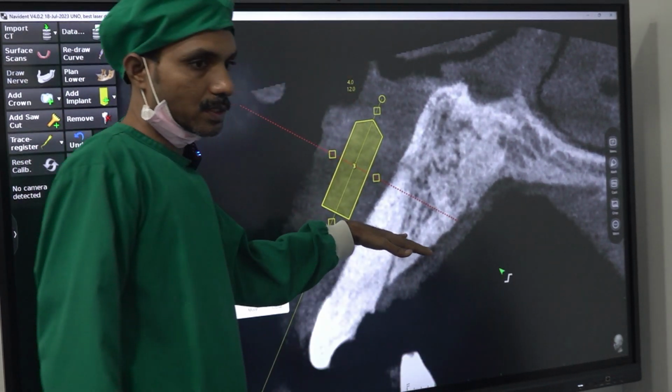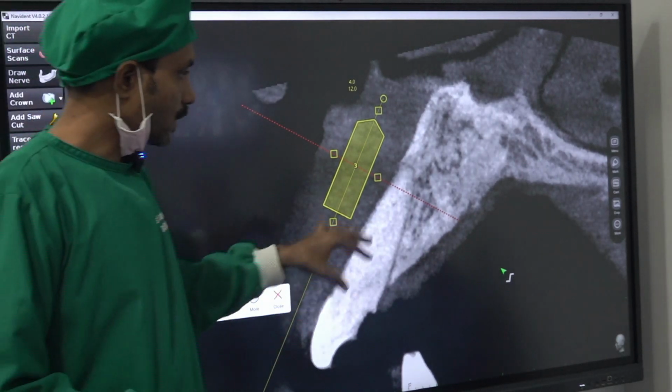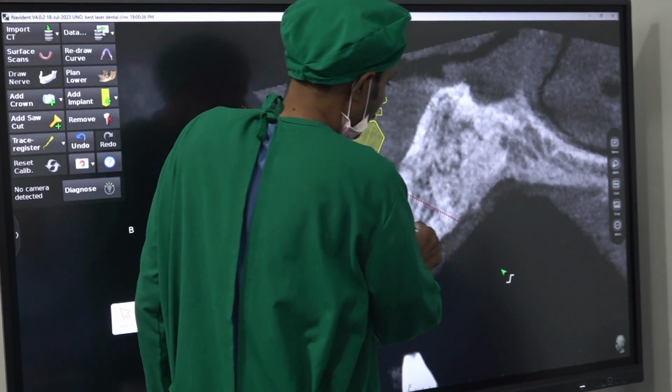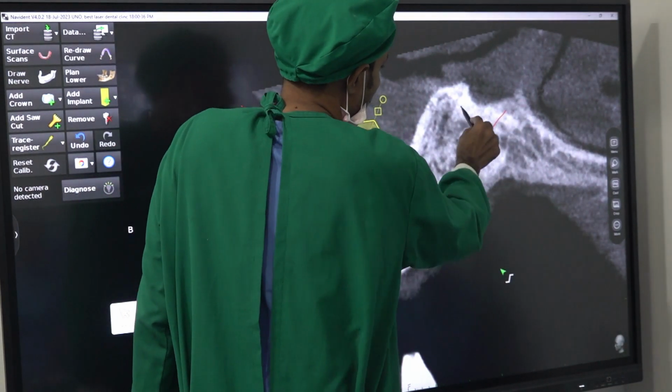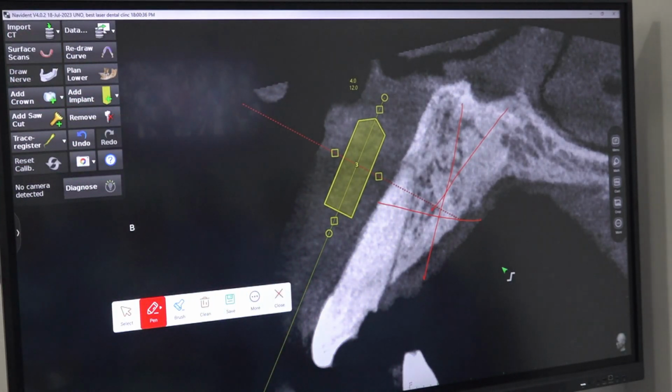So how much alveoloplasty we do is based on the lip movement, gummy smile or what? So definitely for 4 or 5 mm we will be doing alveoloplasty for this patient. So maybe till here. Okay. After that we can place the implant like this. The nasal floor is good, excellent bone. Okay. So we will be placing one more implant. You see the maximum length we can get is around 18 or 20.